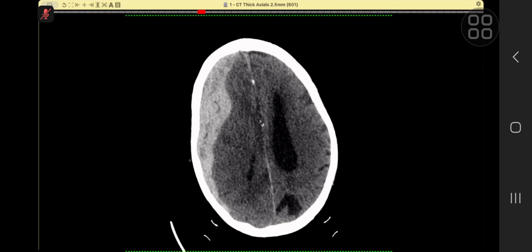The patient was sent home from A&E and became unconscious, was living alone at his home, and later on was brought in. Because he was unconscious, the neighbors alerted the police, and when the patient came in, this is the picture. He had a subdural hematoma. And this is the subdural hematoma window.